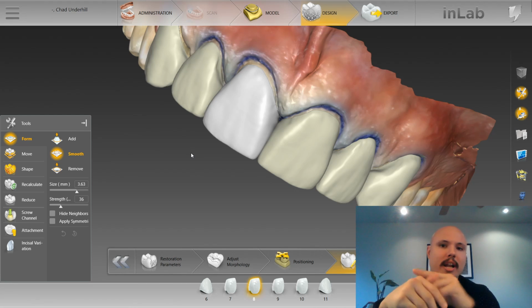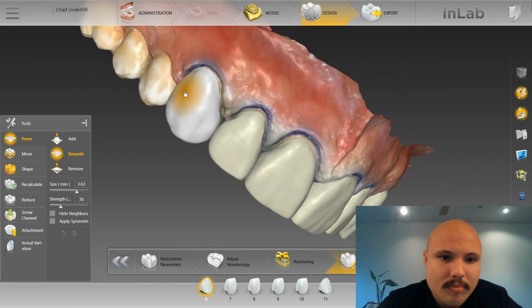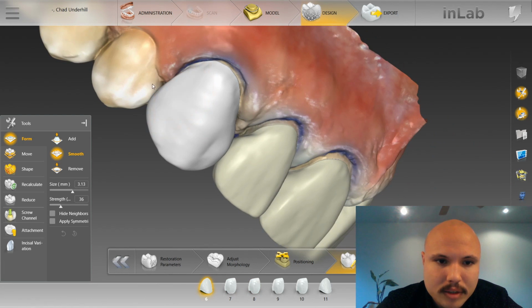But because we're chit-chatting, I guess I'm talking, it did go by a little bit slower.